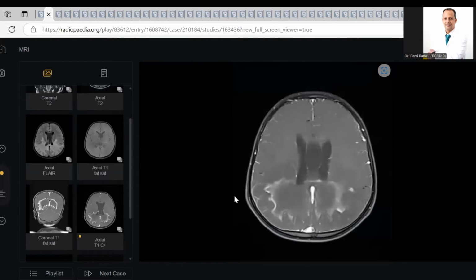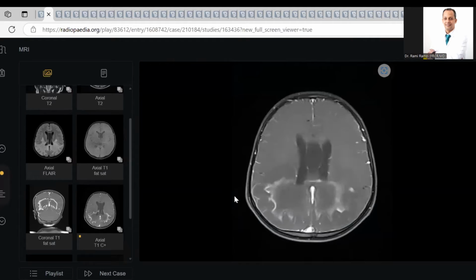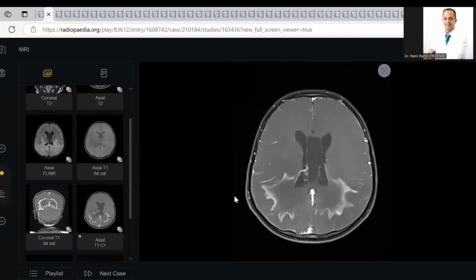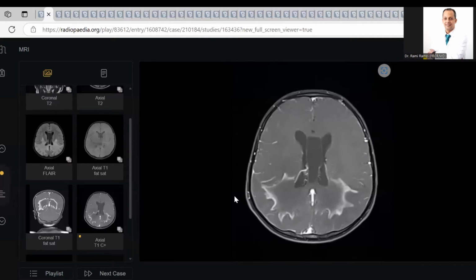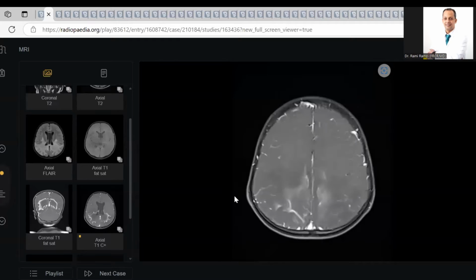Excellent. This is the post-contrast. There is advancing edge of enhancement in post-contrast T1 images, which further confirms my finding of adrenoleukodystrophy. I would like to screen this patient for any adrenal dysfunction, and I would convey my finding to the referring physician for genetic screening and metabolic profiles.